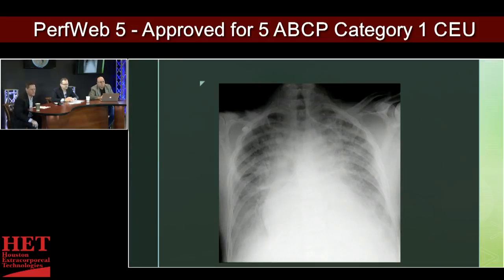Well, I don't know. It looks like there's dispersed fluid everywhere. I can't see much of the heart. I can see a little bit of the right side of the heart, which looks large to me at first glance. And there's no real clear outline of the lungs. So I'm going to take a wild guess and say this would be more of an edema situation. Am I correct? Well, I think it's pulmonary edema, but I think it's because the heart is stuffed.